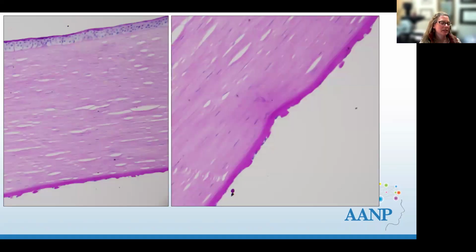And so, of course, our PAS highlights this very nicely. So the way that we write these up is that Descemet's membrane is thickened, and it has those guttate excrescences, and that fits with Fuchs dystrophy. Now, as you get older and you see corneas transplanted from patients who are older, sometimes peripherally you'll see a couple of these, and that is not Fuchs dystrophy. In Fuchs, that beaten copper look is all the way across Descemet's membrane throughout the corneal button.